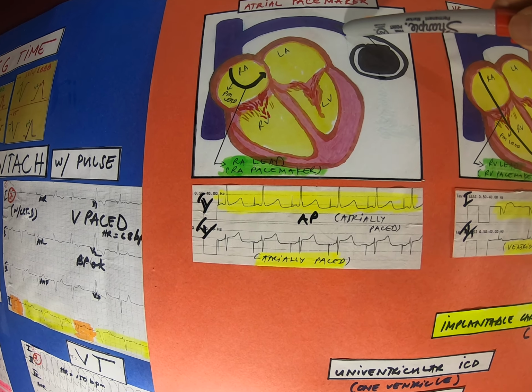The ventricular pacemaker is usually used for patients with slow AFib or slow flutters. They don't have a good sinus beat, so this is the kind of pacemaker they will use. The right ventricular lead is here, and the tip, as I said, is at the right ventricular apex. If you look at the ECG here, we have a ventricularly paced rhythm, or shortcut V-paced rhythm.